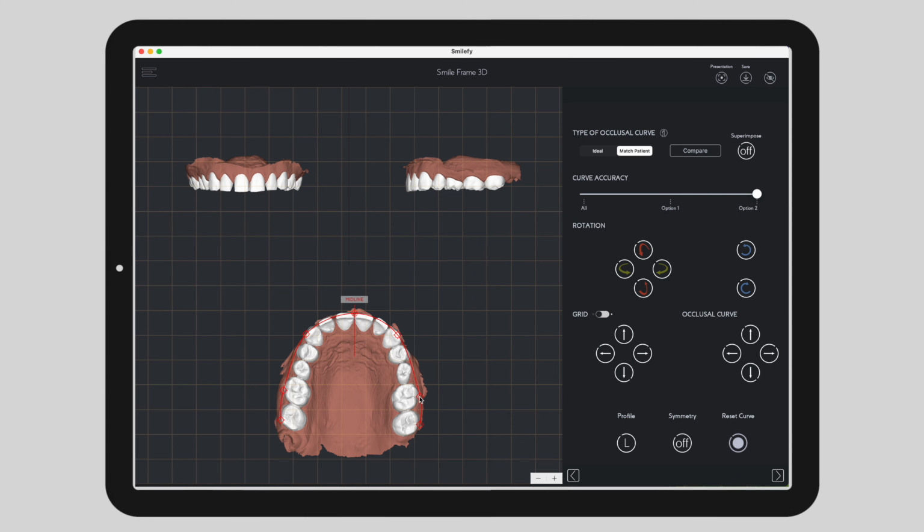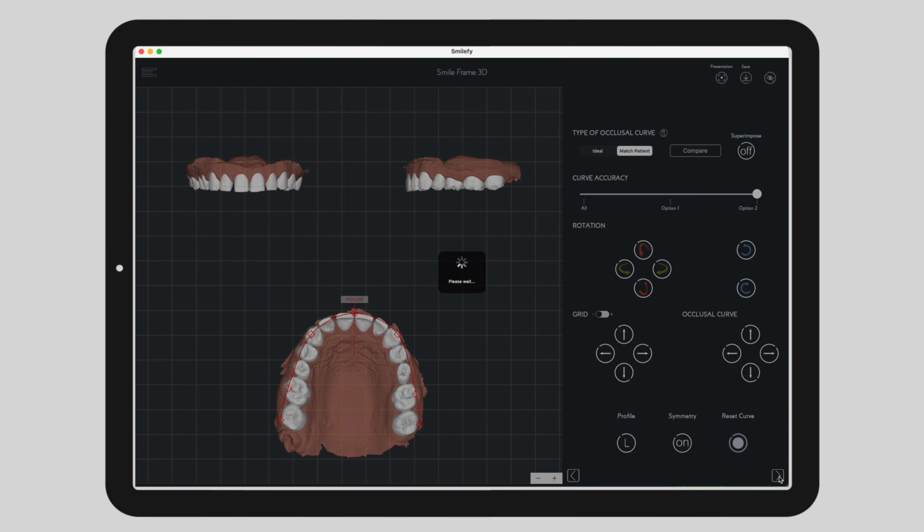Decide your treatment path. These curves help guide your clinical decision-making. Follow the green curve, suitable if planning orthodontics or aligner therapy to create a more symmetrical arch. Follow the red curve, best if you prefer to maintain the patient's natural arch form and perform aesthetic correction, veneers, bonding, crown lengthening.